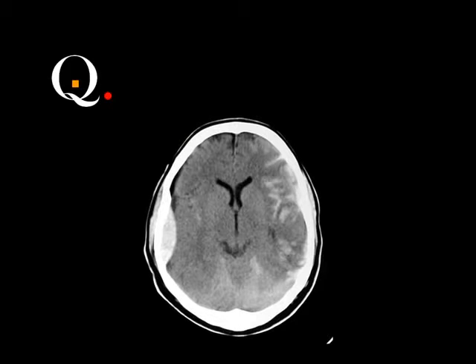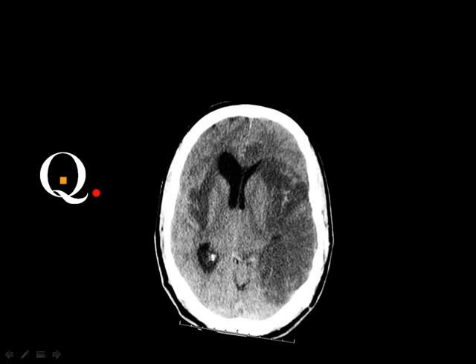Epidural on the right side, yes, very good. Epidural on the right side and subarachnoid on the left side. And this is actually a good association in trauma. You may get epidural hematoma and subarachnoid hemorrhage in the same case. What do you think of this? Left infarction, acute, right?